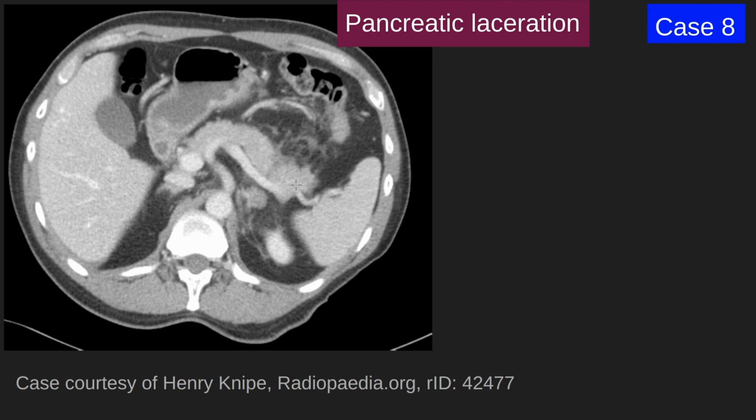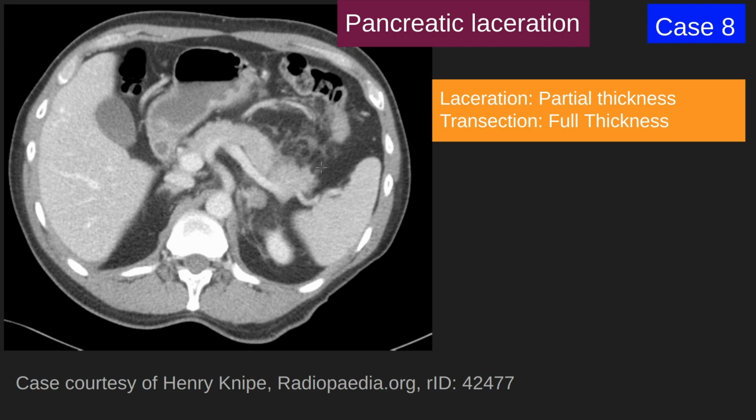Once we know that there is pancreatic laceration in this particular case, it's important to identify if the main pancreatic duct has been injured. Evaluation of that is difficult on CT. ERCP or MRCP are the next modalities of choice for further evaluation.